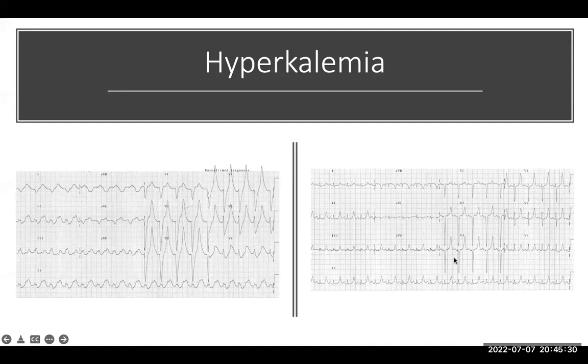As you can also see in this ECG, there is a T wave. The T wave is taller than the corresponding QRS and is in all the leads, whether it's lead 1, 2, 3, AVF, VR, it doesn't make a difference. So that tells you that this is hyperkalemia.